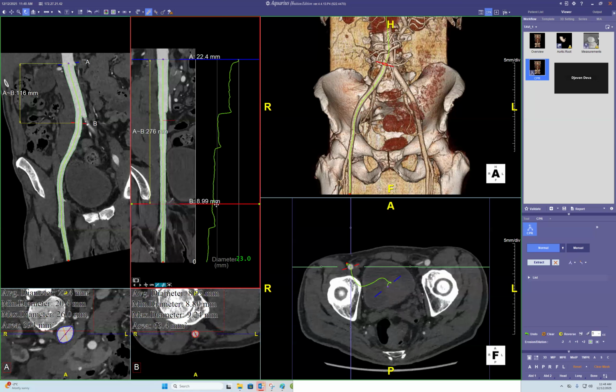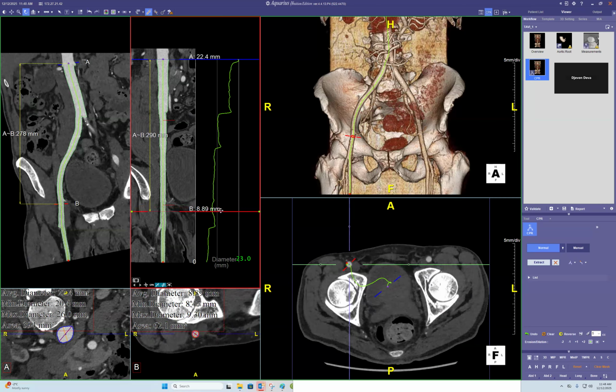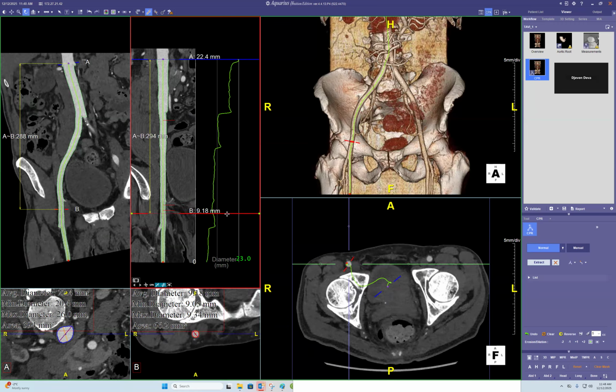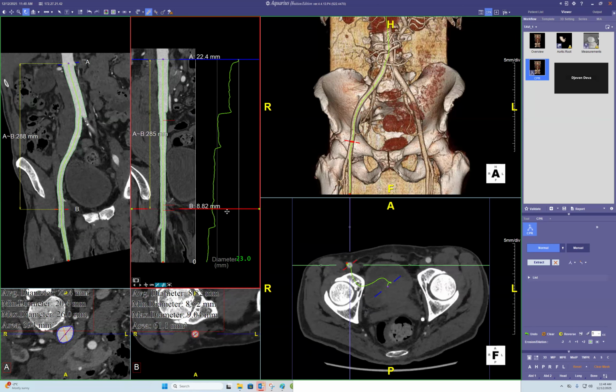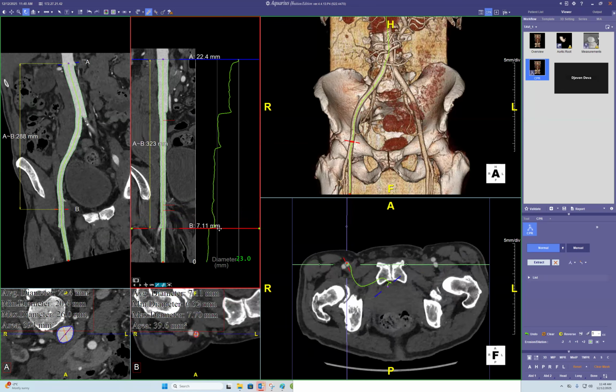And by the looks of things, it is right here at the end, maybe 8.9. And then we're going to go for the common femoral, and our narrowest part of the right common femoral is 8.7. I'm also taking note of the common femoral artery quality and where the common femoral artery bifurcates, and here it would bifurcate over the lower third of the right femoral head.